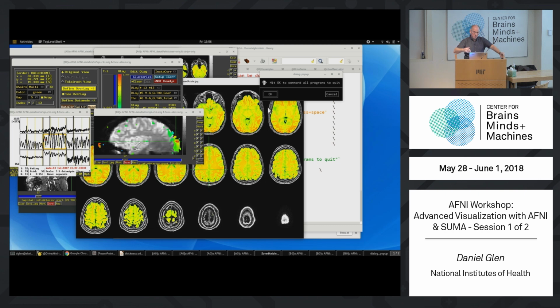I'll show you another thing that we use for looking at lots of different subjects in maybe a little bit faster way. So it depends how much data you've got to look through, whether you've got 10 subjects, 20, 100, 1,000, 10,000, you know, it's more or less detail. So we've got different tools for different jobs.